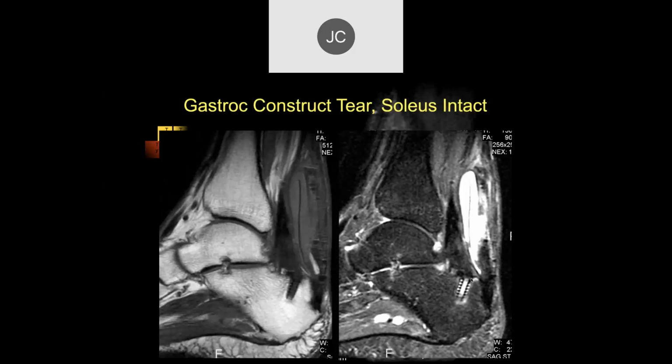So, yeah, part of the problem with radiology is that in these postoperative cases, we tend to see the failures. We tend not to always see the successes. A decade ago, surgery tended to be very popular, especially on the East Coast.